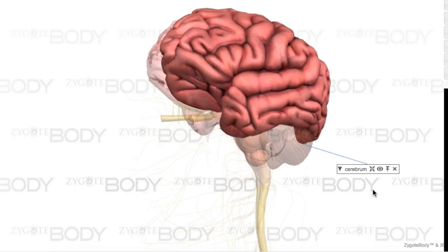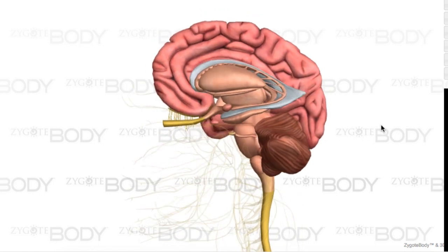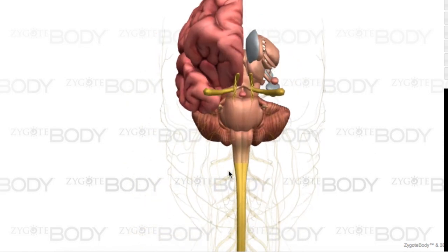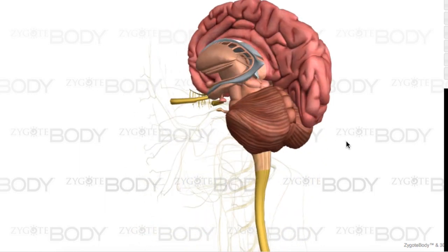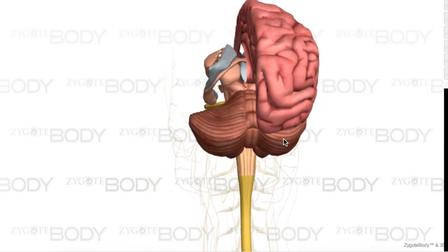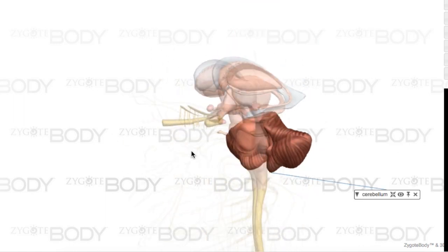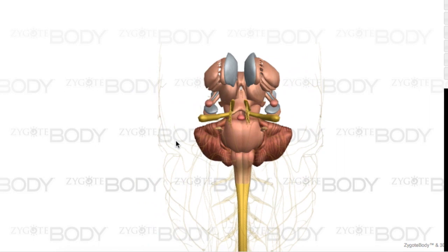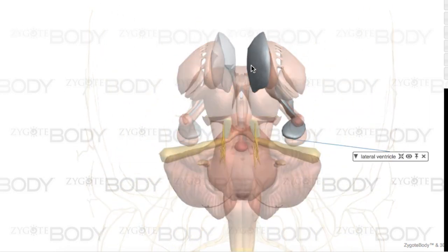So if we peel away that layer, the deep nuclei and lateral ventricles are revealed, and as you can see, are mostly midline. So that's the first trick. On any axial section, always have your eyes go straight to the midline to see what structures are present or not. And in terms of landmarks, the most superior midline structures would be the right and left bodies of the lateral ventricles, and the right and left bodies of corpus callosum, which is not shown on this model.